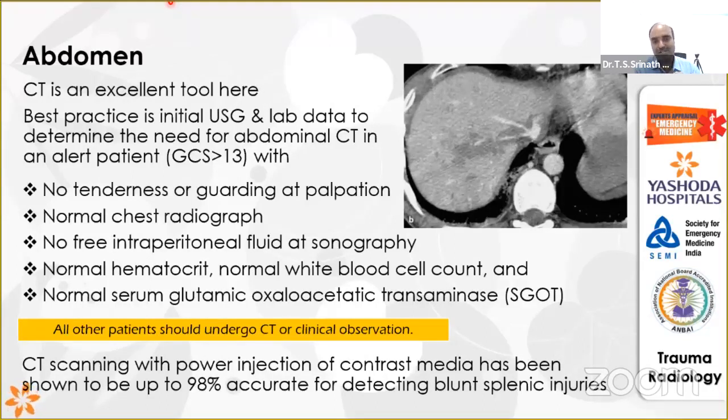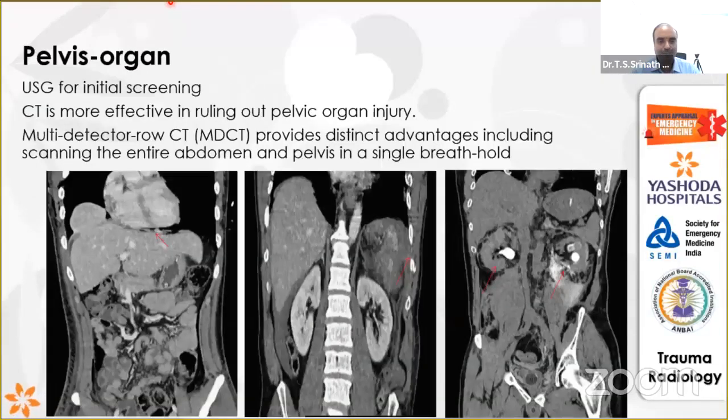So pelvic bone again, I'm telling you, when you take any X-ray, look into the contours, inner contour, outer contour. Where is the fracture? You see. Does this patient require a major intervention, this one? May not require, because you can see both the pelvic bones, it is intact. There is no gaping. But still, the treatment is required.